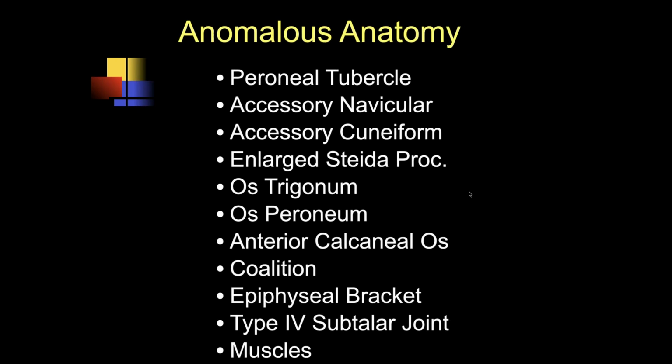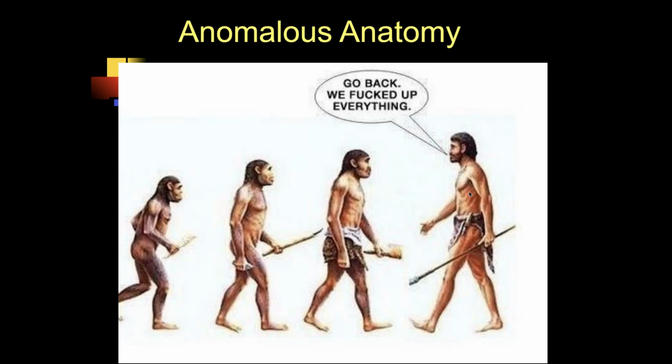So in the foot and ankle, there are a lot of anomalous and anatomic findings, and some of these are significant, and some of them are just kind of interesting. So let's go through some of these.